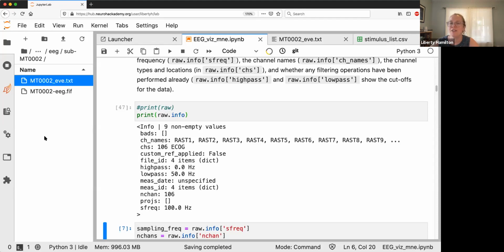If anyone has questions about the rest of this, you can go through it on your own. And I'd suggest looking at the same electrodes, see how different those are for these different sentences, because it's cool.